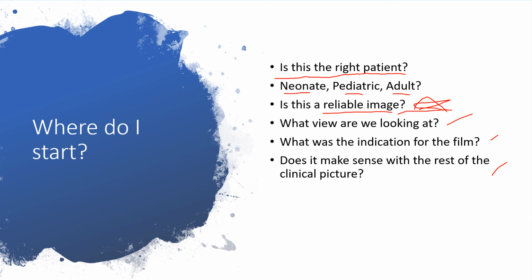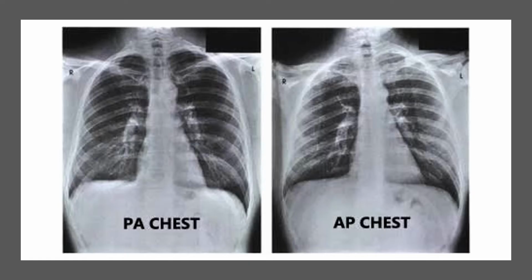So sometimes the X-rays will lag behind the patient's condition a couple of days, and you will see this in the literature out there. I'm not the only one that makes note of this, but does this make sense? The X-rays can lag behind. I can have a patient that's about ready to get extubated off of a ventilator, and their X-ray actually looks worse. Well, the X-rays are sort of lagging behind. It's still showing that residual inflammation that's going on in their lungs. So that's something that we just got to be aware of.